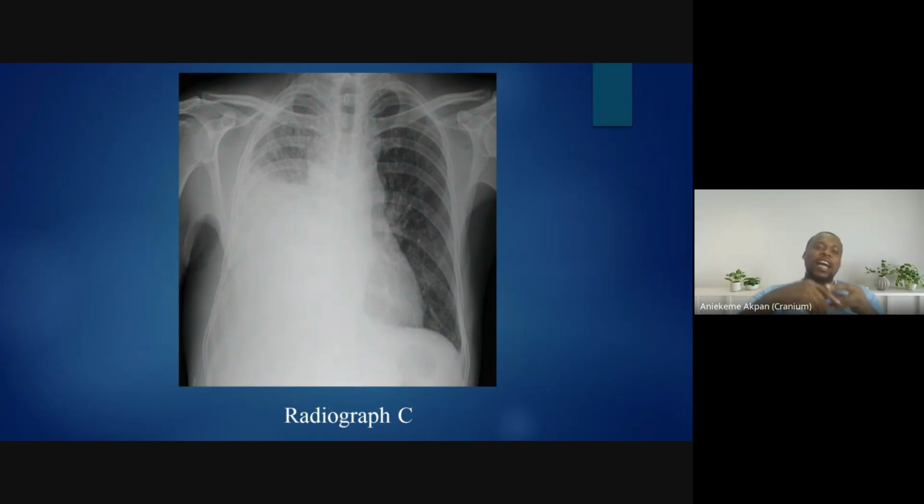And they can only adequately call this hemothorax because of the history. Maybe they will see fractured ribs and the rest. But you will see blood accumulation, not like blood, it will still be looking white. That's why I said most of these things are just looking white and dark. So history helps them. For a radiologist to convincingly say this is hemothorax, there must be a convincing history of maybe a trauma and seeing fractured ribs and the rest.